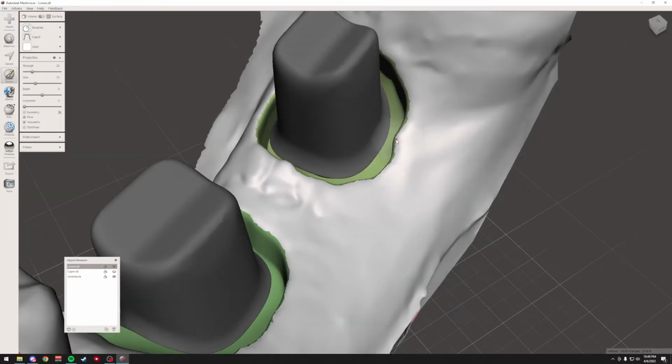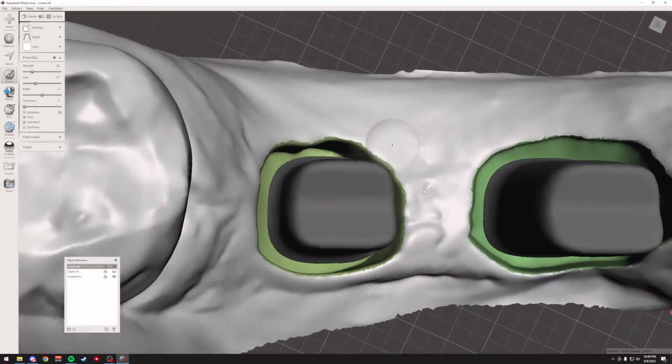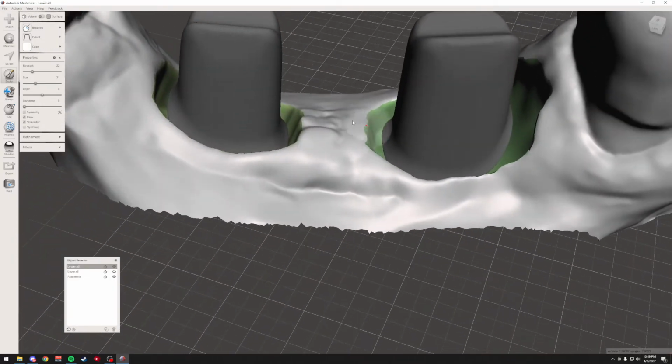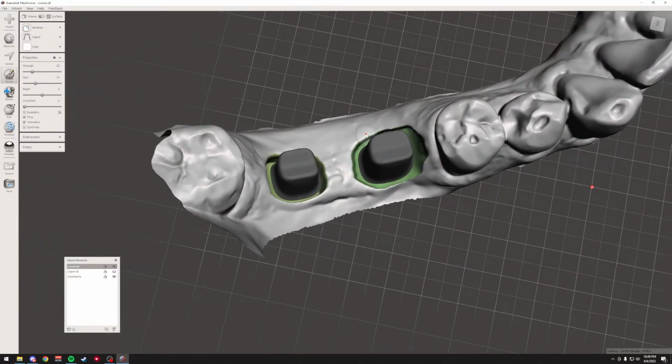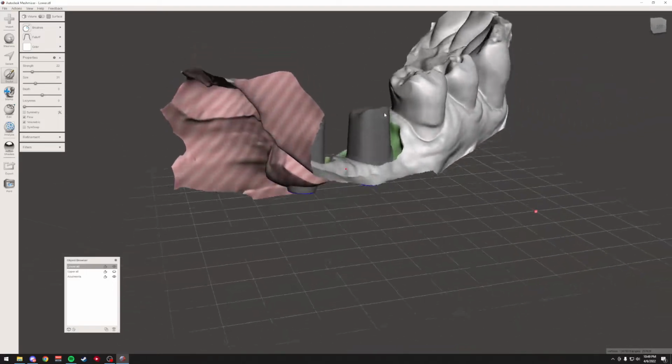Awesome. Okay, so I'm not going to spend a whole lot of time on that. Just like before, if you find little areas that are going to get in your way, you can always move those out of the way or adjust them. Sometimes you may even find it's easier to adjust it by hand. But for this, we've pretty much achieved what we set out to do.